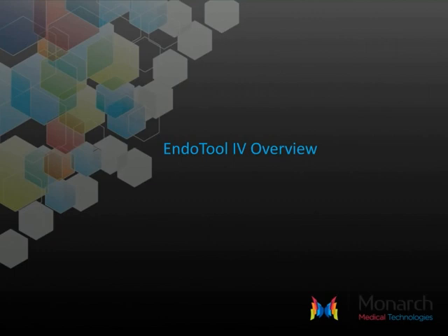Welcome to the EndoTool IV overview. This program will introduce you to the functionality of the EndoTool IV application.